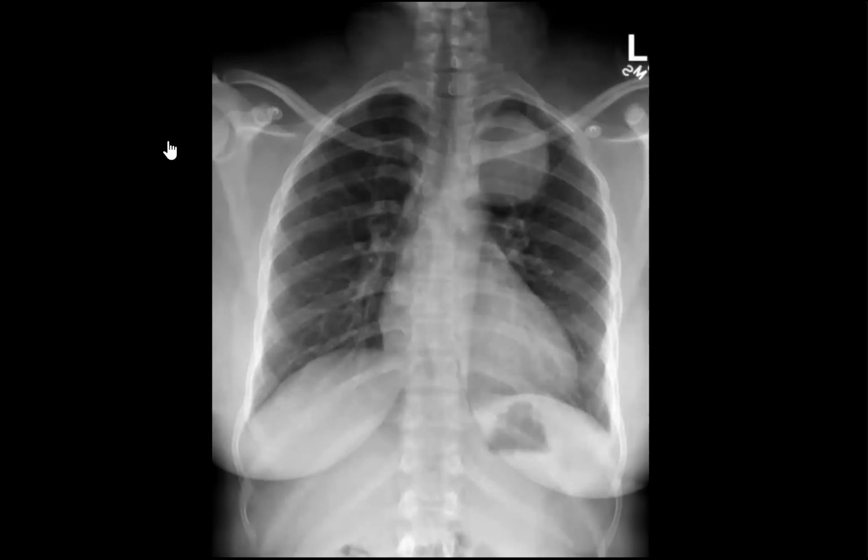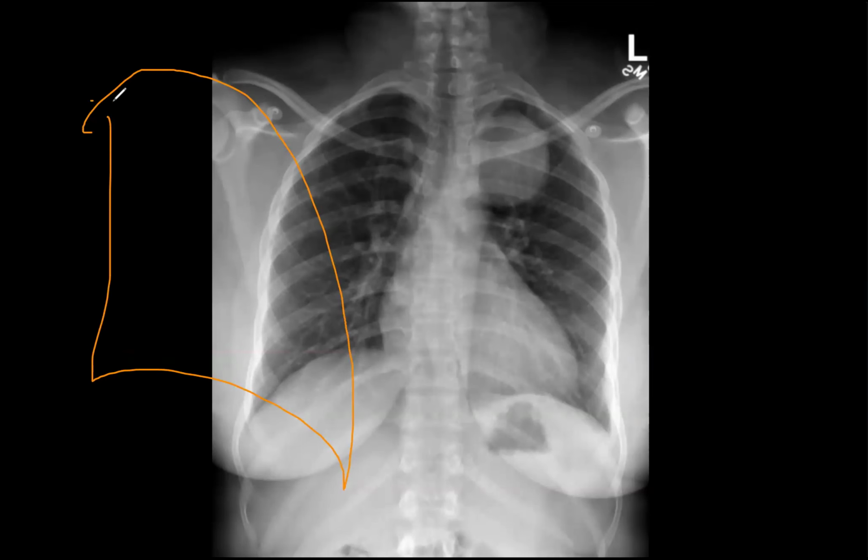I'm sorry, I just wanted to explain what's meant by the cervicothoracic sign, because some of our colleagues are confused with this sign. It's very important in the exam. This is a chest, and this is the clavicle. This is the anterior mediastinum, and this is the posterior mediastinum. The anterior mediastinum is nearly absent above the clavicle, but the posterior mediastinum contains significant lung tissue above the clavicle.